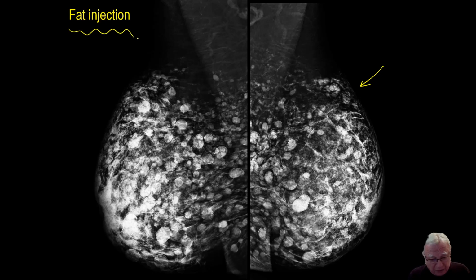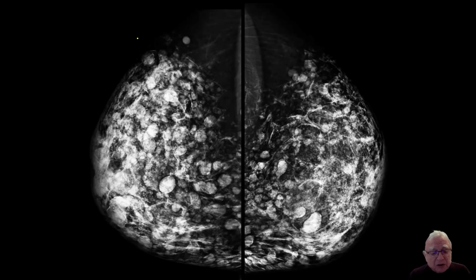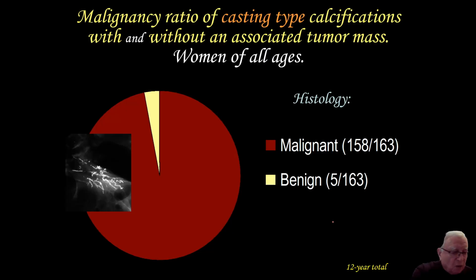But you as a radiologist can handle it very easily because these are radiolucent, at least partly. But of course, you're not very happy because also this patient expects that you and me are going to find a 1 to 9 millimeter invasive carcinoma here. We are not going to. So far, the post-traumatic fat necrosis type calcification was easy.